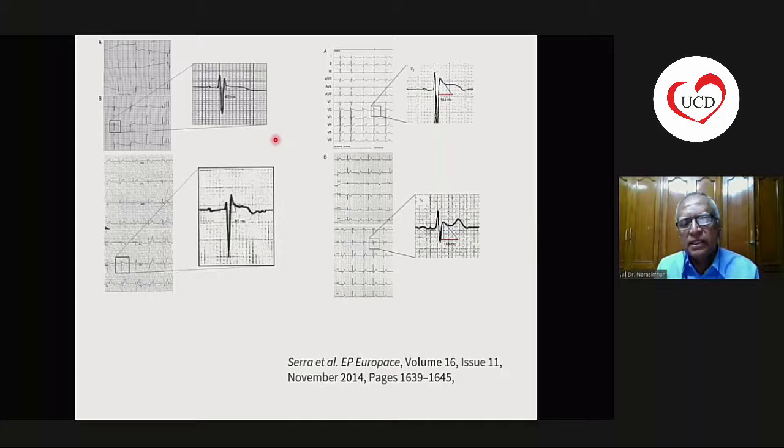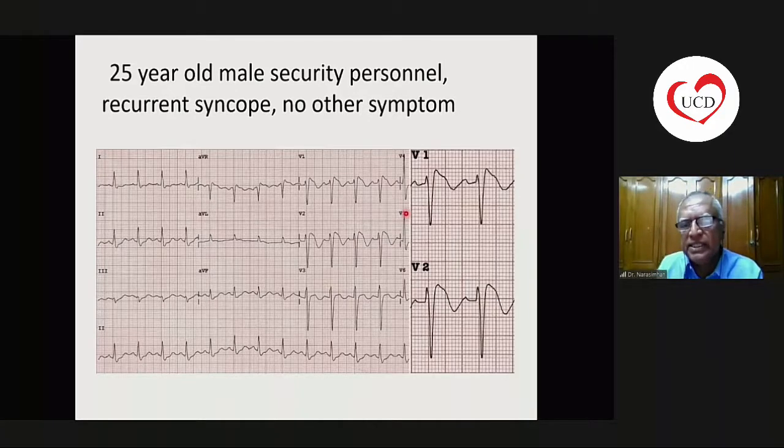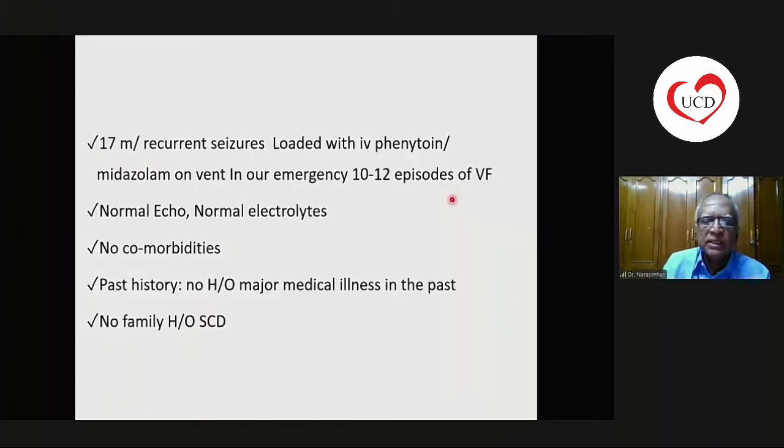The other thing that I would like to emphasize here, this is a classic thing, one of our security guards with a classic Brugada, and he's symptomatic, but can't afford an ICD. This is a common problem for all of us. All the guidelines say give an ICD. Look at this. This angle becomes broad. That is very typical of Brugada. Let me go back to this patient.